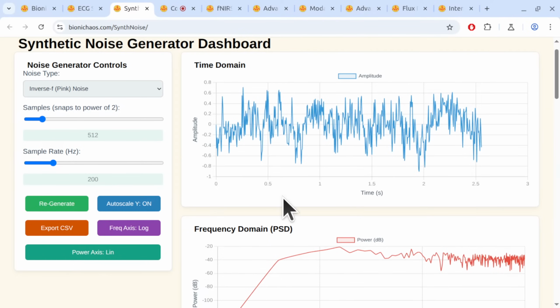Yeah, but is it actually visible in one viewport? You have to change this to 100% screen size. Can you comment? Got it. At 100% screen size, the controls and both charts are visible in a single viewport now. The layout makes it easy to see all the information at once, without needing to scroll.